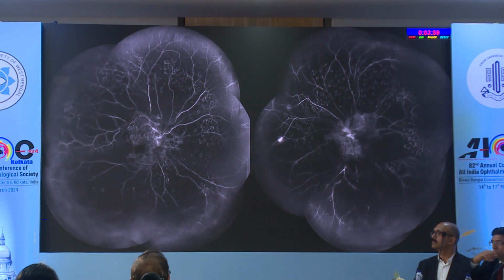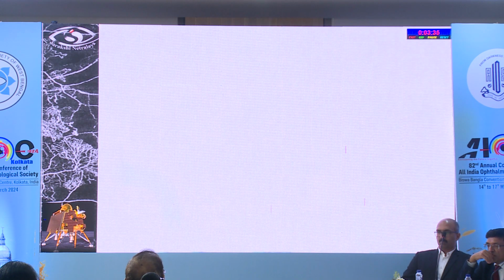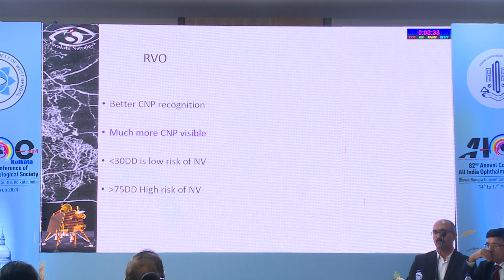The standard teaching is that proliferative diabetic retinopathy is a posterior pole disease. So that means we used to do pan-retinal photocoagulation only up to the equator. While this challenges our basic understanding of this disease, that yes, the dropouts can extend even anterior to the equator, and so is the need of extending your pan-retinal photocoagulation right from the arcade up to the ora serrata, at least in cases where there is recurrent bleed or in a case of a recurrent diabetic macular edema.